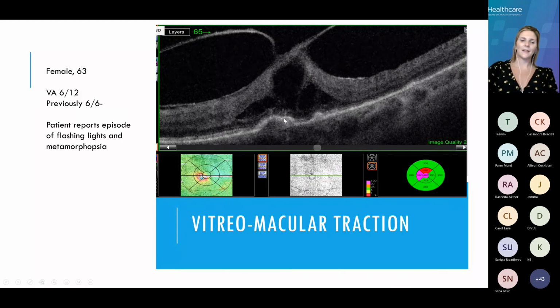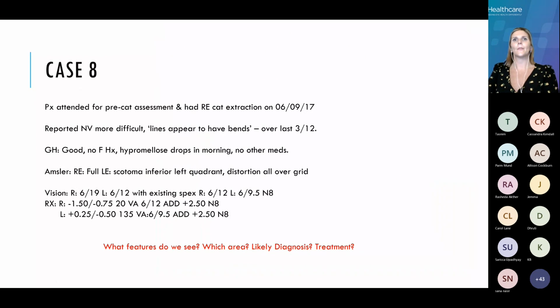with someone like this, they may need to go and obviously have a second opinion from an ophthalmologist and be able to then decide whether or not they would actually need treatment. Now, it may be that this pings off and settles down on its own, but because of everything going on with this patient, you would want to use the OCT to educate them, but also maybe to move forwards. Okay, so we're on the last one now.